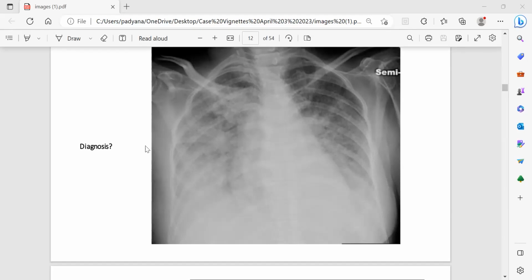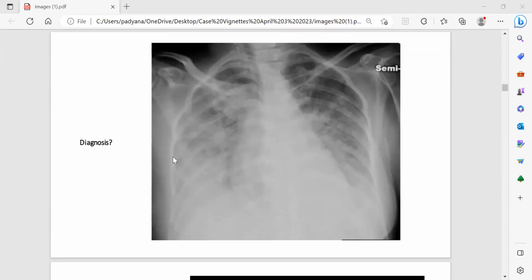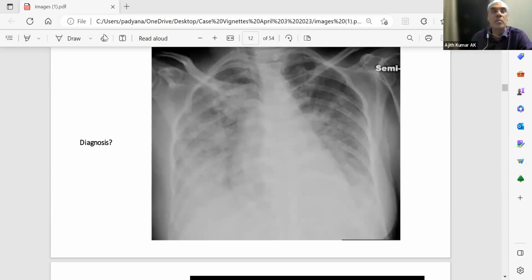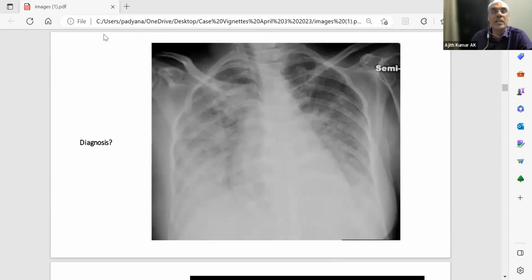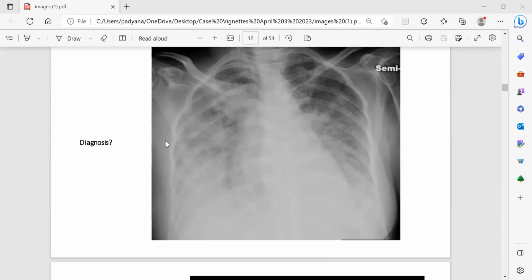Or it can be a patient with pleural effusion taking the film flat. Yeah, excellent. That's true. So it could be a simple cardiogenic pulmonary edema as well, isn't it? You don't know otherwise. It is non-homogeneous. So you say that it is a bilateral, non-homogeneous, symmetric picture at this point of time. So the features are consistent with pulmonary edema, either cardiogenic or non-cardiogenic.